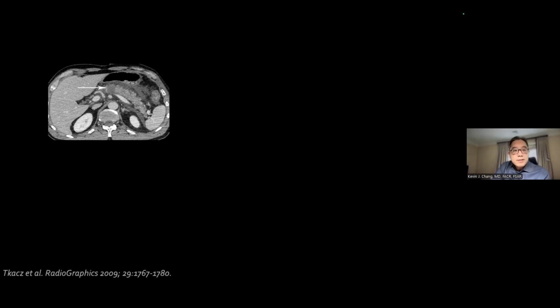And then I think the last topic I'm going to talk about today is evidenced by this case here. So I'm showing you a CT here, very similar to some of the other cases I've shown you already before, where you've got a CT image showing peripancreatic fluid, fatty stranding, a relative area of non-enhancement in the pancreatic neck. But I'm going to tell you the presentation here is not the same as the previous cases. This patient didn't present with indolent abdominal pain. This was a trauma patient who suffered blunt abdominal trauma.